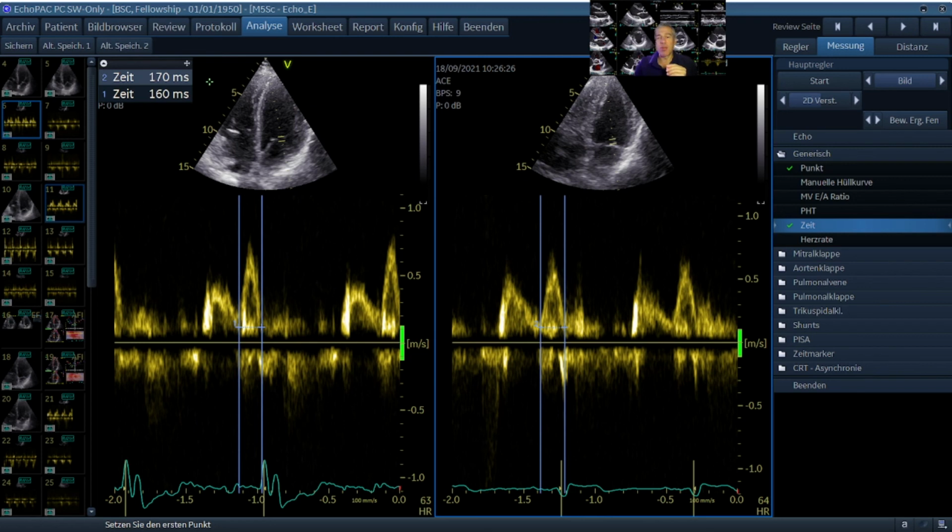It's longer during pacing. If it's shorter during pacing than during intrinsic conduction, then you must question whether the programmed AV delay is too short and that ventricular contraction occurs too early and interrupts atrial filling.